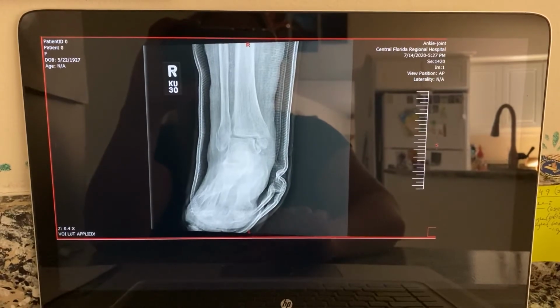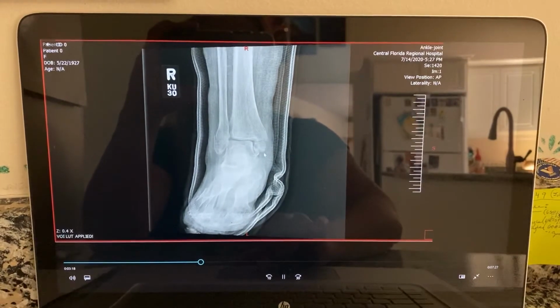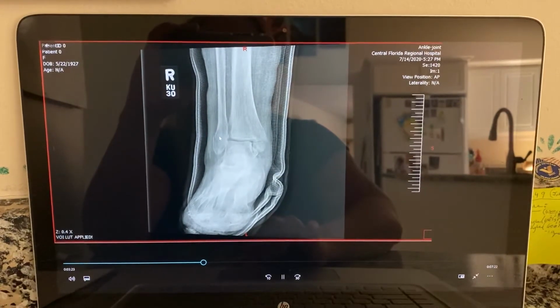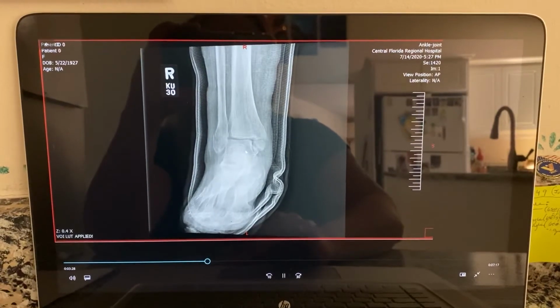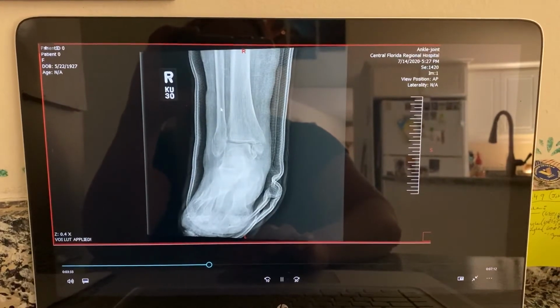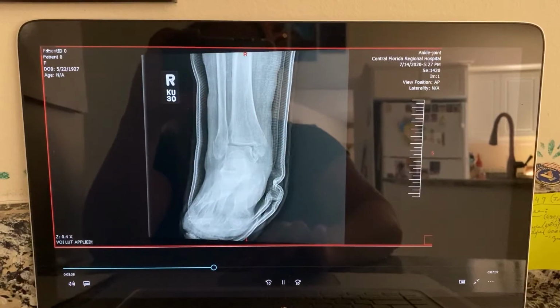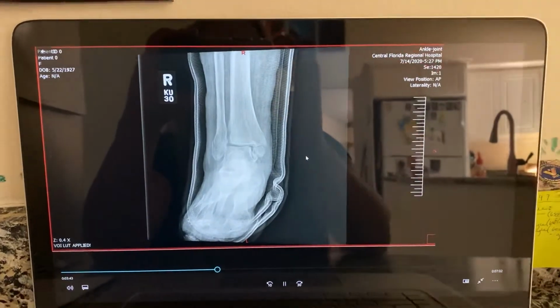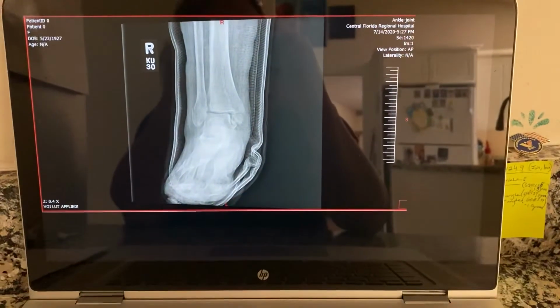Anatomy seen is her distal tibia, her medial malleolus, which has a fracture, the lateral malleolus, which shows the fracture, the distal fibula, the talus, and the presence of distal one-third tibia and fibula, and the proximal metatarsals. A medial mortise joint open would show proper positioning. Her medial mortise is partially open due to the fracture and limited patient movement.